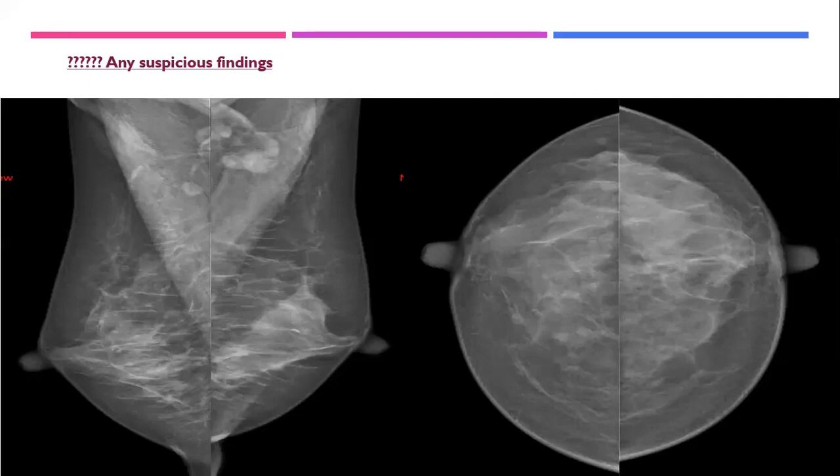This is a really interesting case. I like this case. We learn a lot from it, but try to be a little quicker. You can say positive or negative. Who said it is positive? Raise your hand.